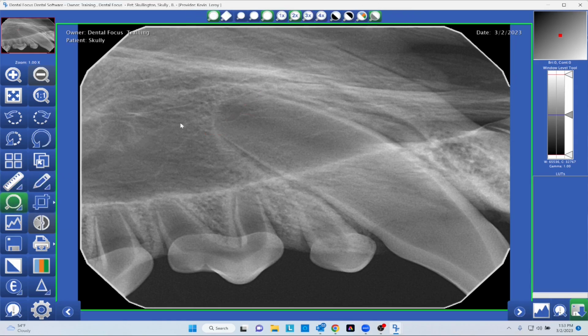Our magnifying glass will give us a specific range of zoom. We can go directly over a specific area of pathology or anatomy and get a closer look in one particular zone. We also have adjustments for that. We can change the size of the magnifying glass, the amount of zoom, and colorization or inversion. Now these guys, a high contrast or a negate effect.